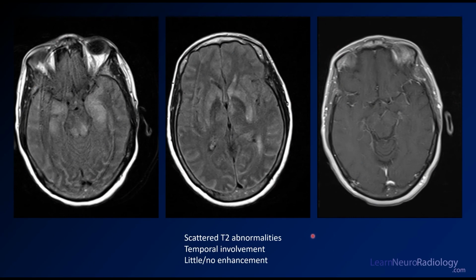Here you see those findings again. You just have these scattered T2 abnormalities. There's a lot of temporal involvement here, and you have little or no enhancement in this case.